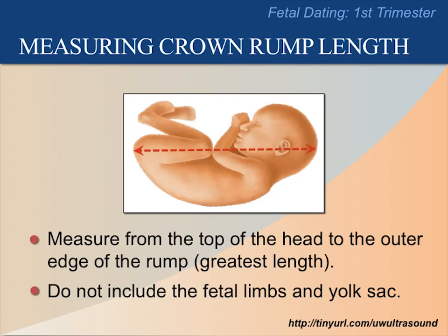To measure a crown rump length, we measure from the top of the head to the outer edge of the rump. Do not include the fetal limbs and yolk sac. Please pause the video now to ask your trainer to demonstrate the correct area to measure on a doll.